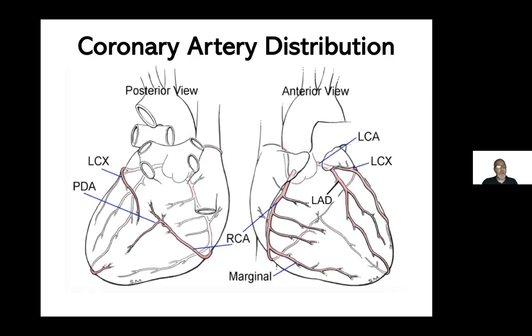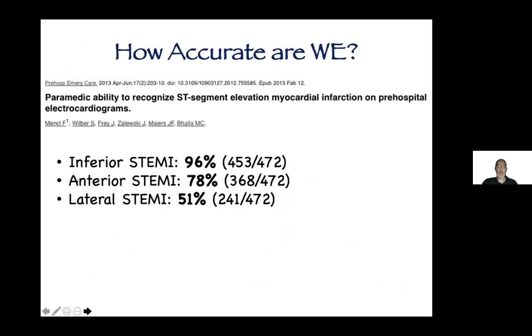For example, and this does directly impact your treatment, any patient with an inferior MI pattern gets an automatic right-sided EKG at an absolute minimum, because about 40 to 45% of inferior wall MIs involve the right ventricle, which means if you give them nitroglycerin, you could effectively kill them. And in medicine, that's basically rude, right? The treatment would be volume for those folks. I'll show you some examples of both right coronaries and left circumflex, and I've also got a really good EKG of right ventricular infarct.